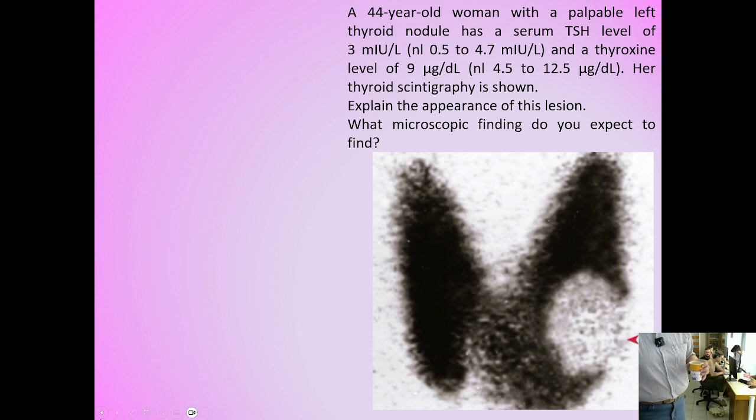Now, what is different here? Have a look at this scintigraphy. This area does not uptake iodine, radioactive iodine, so it is thus described as cold. But this is a nodular lesion, so we have a cold nodule.